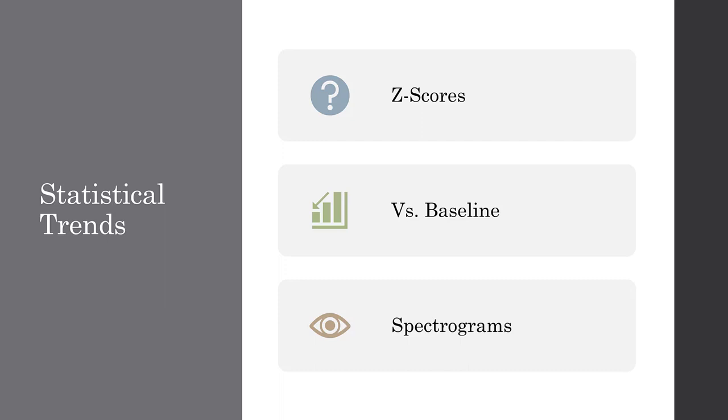So up until now, we've been looking at trends that show what's happening in the EEG for whatever parameters are being trended at the particular moment. So if it's deflecting one way or another, or color's changing, it's changing in the underlying EEG. So looking for changes is done visually. And if you don't see a change within the trend panel, you can increase the duration or go back to a previous day's recording or go back multiple days.